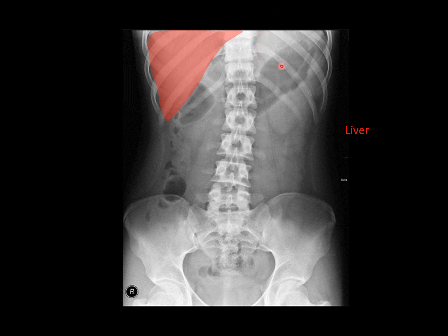It's not quite as apparent as the edge that the liver formed in the right upper quadrant, but that will be our spleen. The reason it's not quite as apparent is because usually the stomach's in the left upper quadrant and the spleen's a smaller organ, and that gas from the stomach obscures the margin of the spleen a little bit more than bowel does in the right upper quadrant.